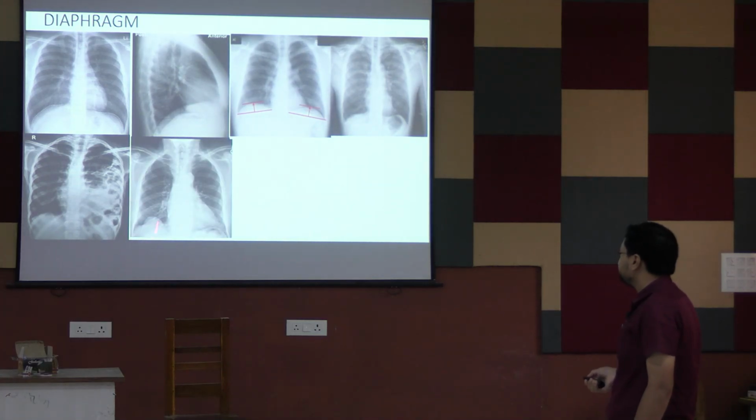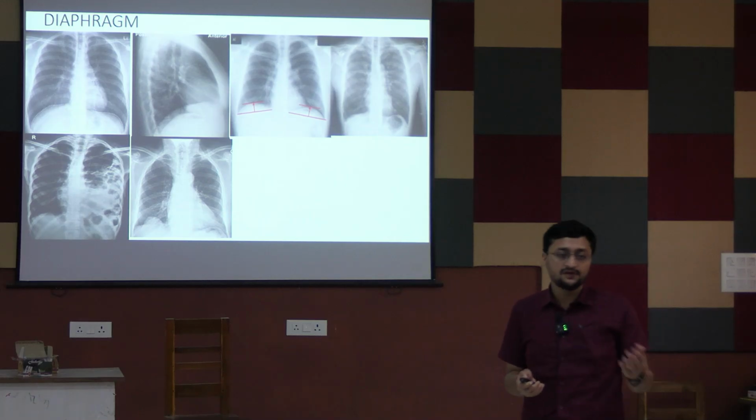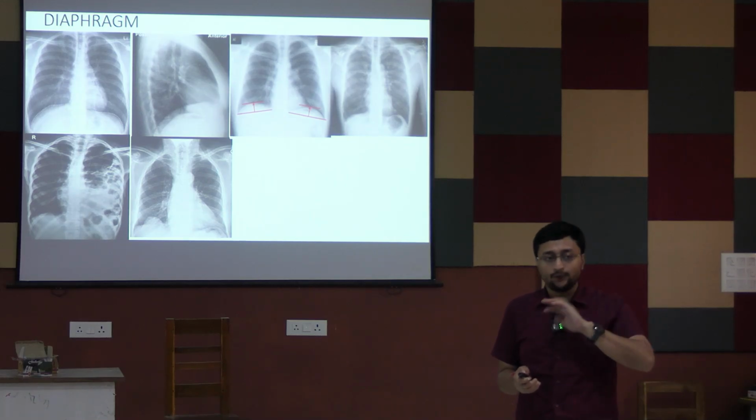Another, this is called diaphragmatic hump. This is a congenital deformity, but it does not cause any problem for the patient. This is just a finding, right? So diaphragmatic hump.